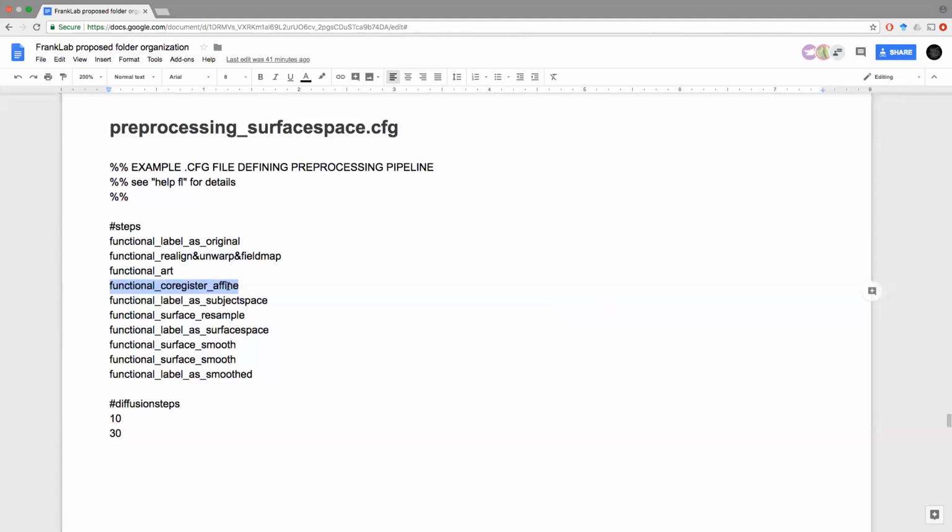And the reason that we need to do that is because the FreeSurfer step is run on the actual anatomical data, because it's the data that is high resolution, and that is going to allow us to estimate these surfaces in a very nice way. But the functional data that we care about is in a different space, and is typically scanned a little bit later. So those two, the structural and functional data, might not actually be in the same space. So you need to co-register them for them to be in the same space. And that's why we need to do co-registration.